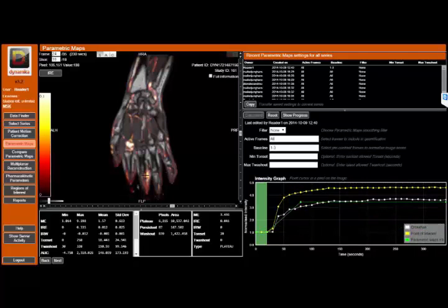Very high enhancements again, but not as high as in the yellow bar down here, which was in the very high enhancing area in the second MCP joint. So it's really easy, with this tool, to analyze and get an idea of the various enhancement patterns in the area of interest, to separate the vessels from the pathological enhancing tissues from the normal physiological enhancing tissues like muscle.